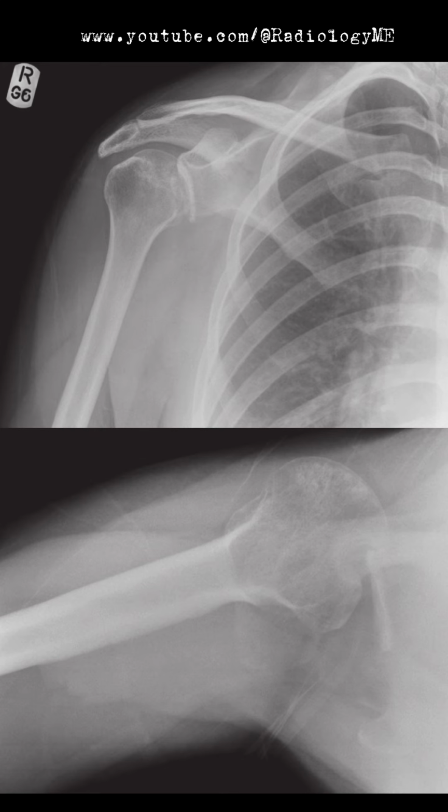This immediately raises the suspicion of a posterior dislocation of the shoulder, which, though less common than anterior dislocations, can sometimes be missed. We can also see a large reverse Hill-Sachs lesion on the humeral head, which is an indentation fracture typically seen in posterior dislocations. The presence of sclerosis around the margin of this defect suggests that this is not an acute dislocation, but rather a chronic one. This fits with the history provided, 3 months of symptoms, which is consistent with a delayed presentation of posterior shoulder dislocation.